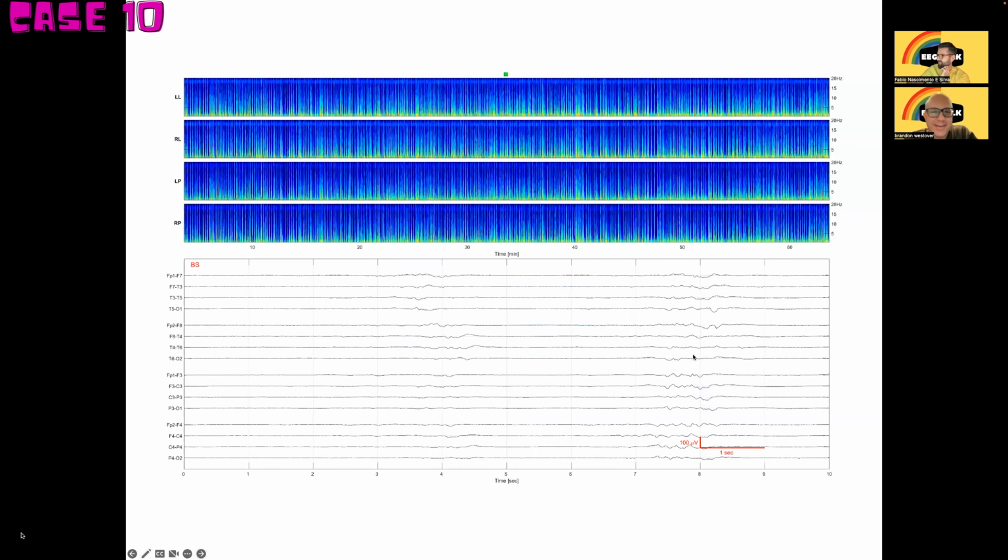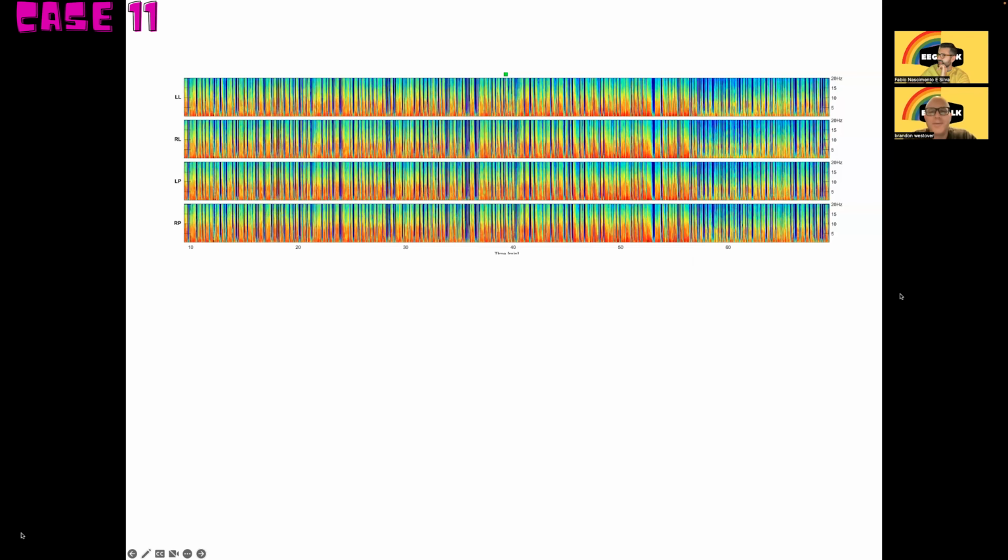Okay. Perfect. Ah, this time they're spiky. They have to be. Yeah, these are angry bursts. These are those highly epileptiform bursts. Yeah, these are stripes with spiky bursts in them. And less suppressed too, right? Is that fair to say?